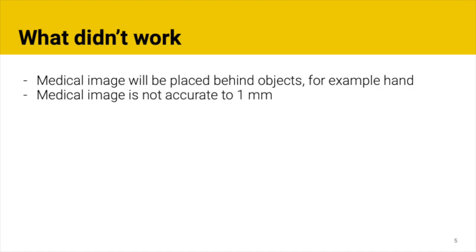The first feature is important for working with the placed medical image, as being able to clearly see your hand or a marker or maybe a syringe will be essential in this project's medical applications. This is a rather difficult implementation since objects placed in an AR model is similar to an overlay on the device's camera, which means by default, AR objects will appear in front of everything in the real world.